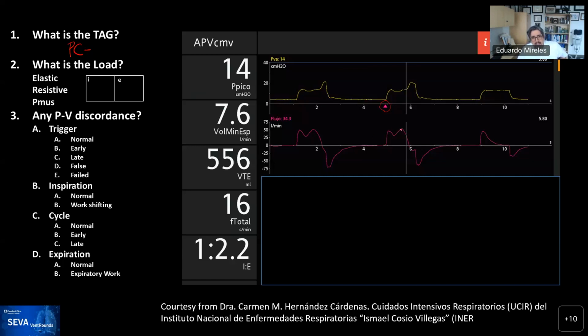And the clue is, if you notice, the flow actually crosses baseline right here by where number 6 is. It crosses baseline, which tells you that the patient is actually now exhaling. And you can see how the flow goes below baseline. And meaning that if the machine is still delivering pressure, under that circumstance, this has to be a machine cycled breath. And so each one of these breaths is mandatory. So just by what we're seeing here, I can make the conclusion that it's CMV, which luckily matches the CMV that says here. So all breaths are mandatory.